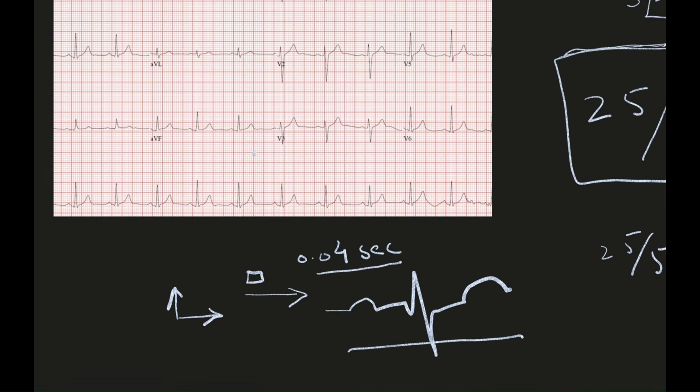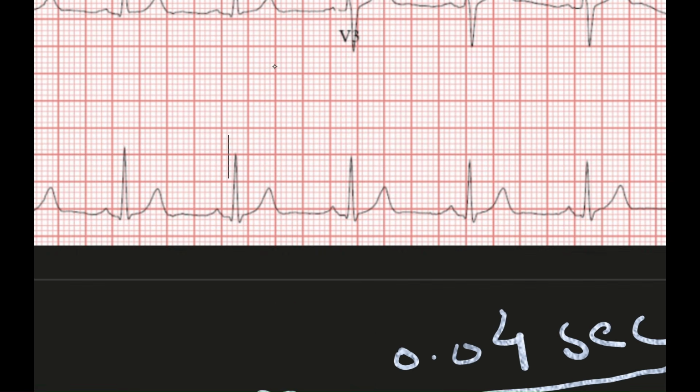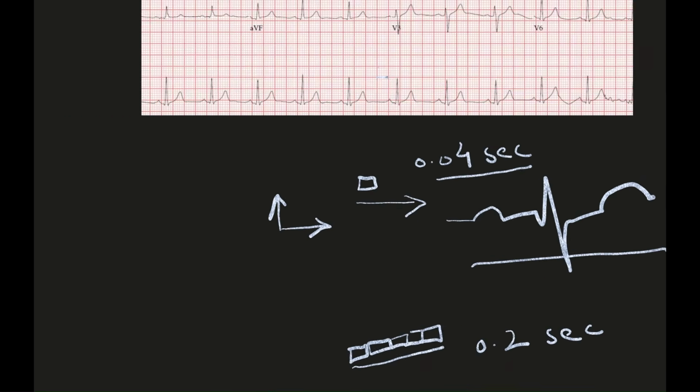Let me show it on the ECG. If I consider these 5 small squares, they total 0.2 seconds.